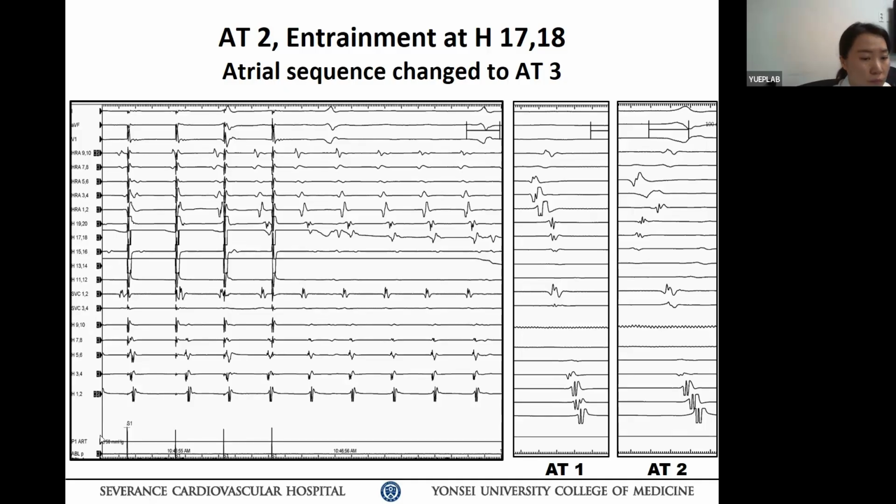There are many manifest fusions, as in the slide you showed us. For example, at first we need to confirm the capture and acceleration of tachycardia, and then we need to compare the electrogram, concealed fusion or manifest fusion, and then we need to measure the PPI and TCL.